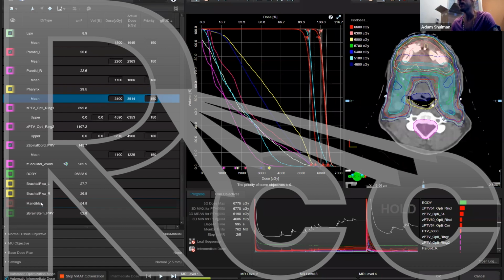The Mandible, again, like we said, it might be a little tricky to achieve that 5% hotspot. This might be one of the very few cases, just because the amount of Mandible in there, that you might have to do a tiny little tweak on a second iteration, but most of the time you'll get a perfect plan on the very first optimization. So we'll see how we do.